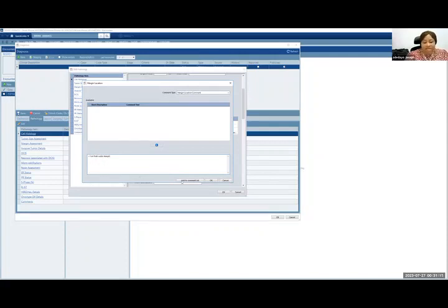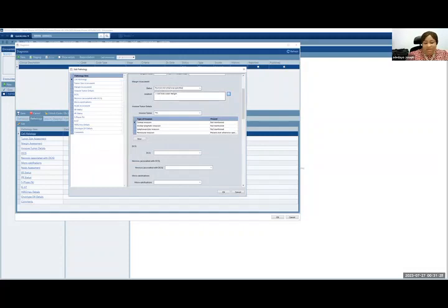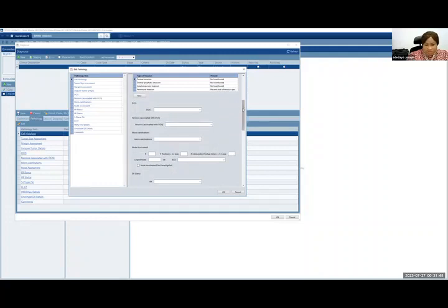And when I put this here, I can say add to comment list. If I click on this, add to comment list, and I give it a short description, and I say 1 cm margin, and I save it. What it means is that the next time I'm filling in information about margins, I can just click on here and it will show me all the available comments. So it's like a way of speeding up your work because you're saving a template for a comment that you use quite often. And there are multiple places in ARIA where you'll find that sort of usage.